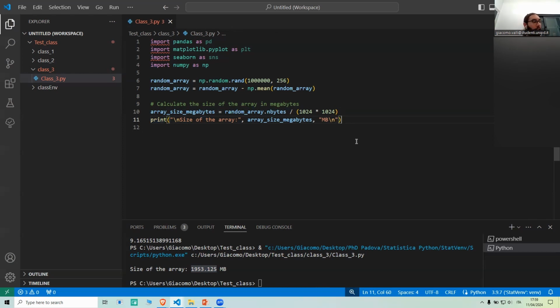We don't need it today, but when you start working with big data sets, if you're working with EMG signal processing, you will notice that at some point your computer will run out of memory, out of RAM. This is because we are storing this array somewhere. It is not disappearing anywhere.